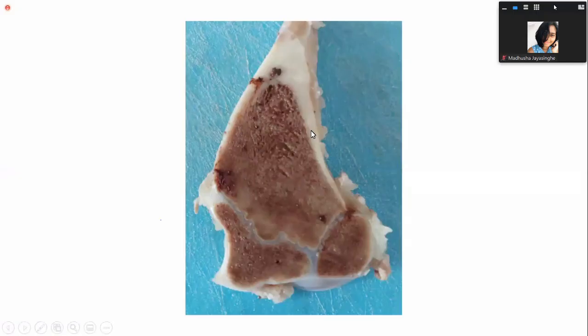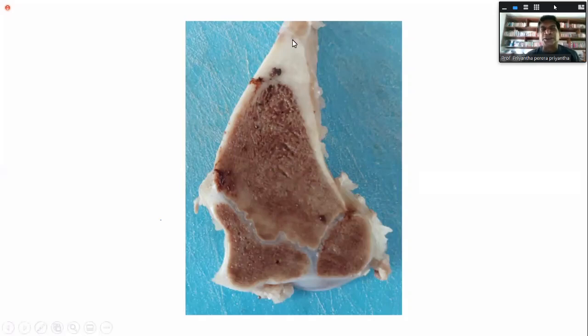Okay. Right. Now this is the bone, right? So at birth you get diaphysis. Diaphysis is the primary bone. When you're born, you get the diaphysis, the bone formed from the primary ossific center, right? And then at the end of the diaphysis, you get what we call the growth plate, which is the cartilage, which is not seen in the X-ray, right?